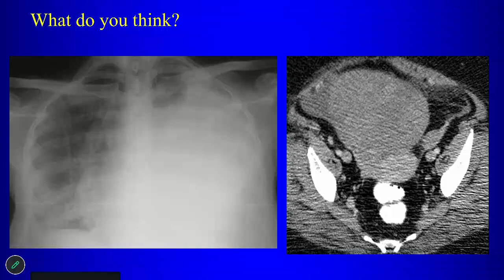So what are we thinking about here? So, what am I thinking? And once again, exudative effusion secondary to metastatic disease. So if you have a pelvic mass associated with pleural effusion, right? It could be ovarian cancer with metastatic disease, that's certainly a possibility. Is there a particular syndrome that we're trying to get at here? What is that?